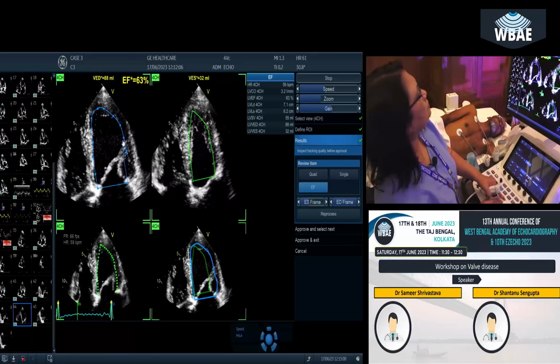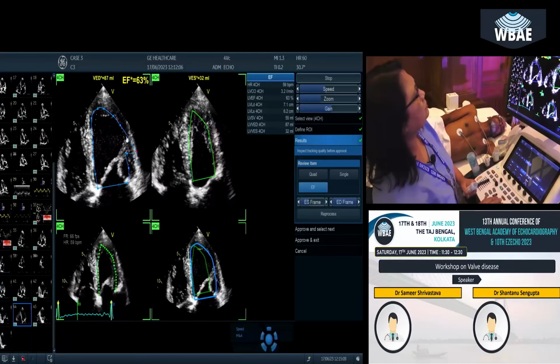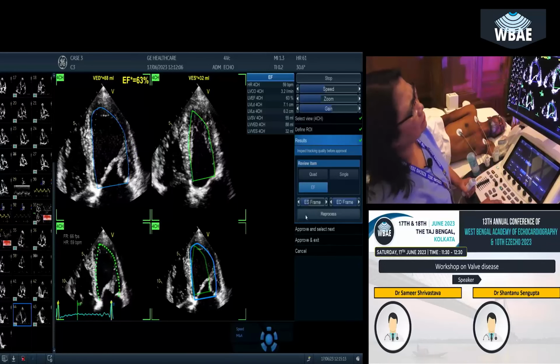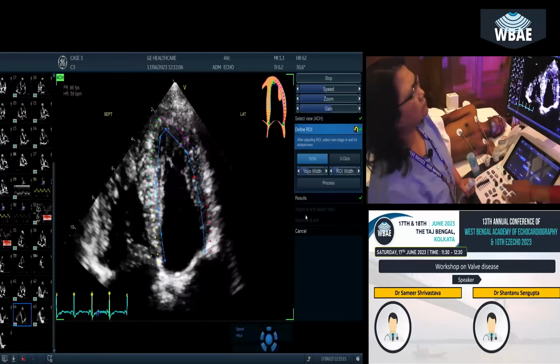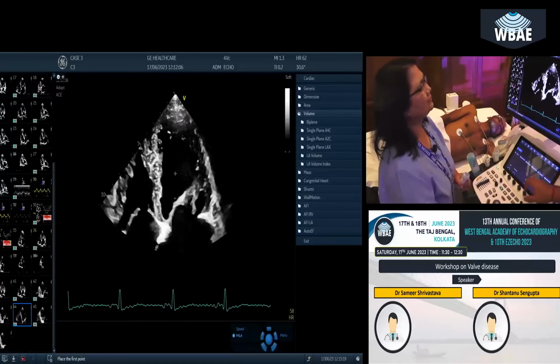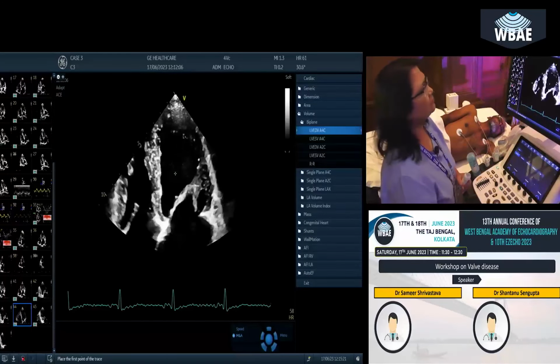Any questions till now? Everybody has an automated machine, or do you have a manual machine? Everybody has a manual machine? After doing the manual also... I will do it, they want manual also. Let's do manual tracing once. Not everyone is running automated. I think we still have. Okay, let's try to trace it manually.